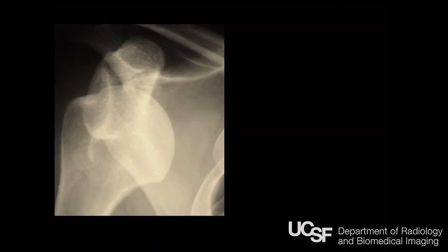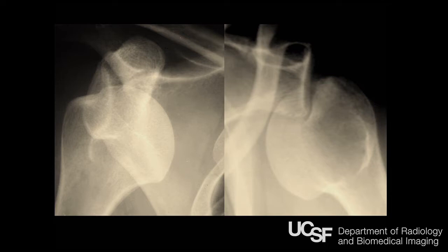Okay, shoulder dislocations. The anterior shoulder dislocation clinically usually is pretty easy. What we're charged with is usually trying to find the fractures that are associated with it. There are two that are important that we talk about. One is the Hill-Sachs deformity. The reason this is important is if it's deep enough, the patient will have what's called an engaging lesion, and with just minimal movement of their shoulder, they will dislocate again.